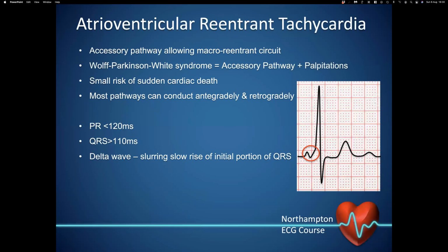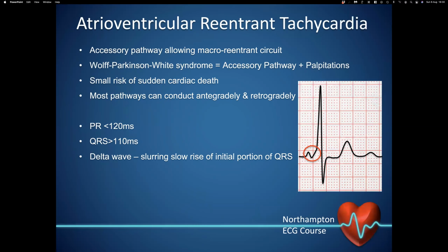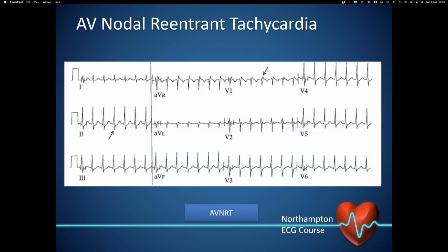Yeah. So back to the previous ECG. The slight upslope of the ST depression, is that rate related ST depression? Sorry, the graph paper doesn't present very well, but this has probably got a rate around 170 beats per minute or so. Okay.